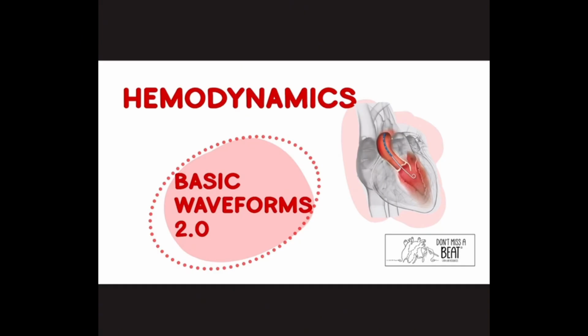Today we are continuing a conversation from a few months ago about hemodynamics, and what we are focusing on right now are the waveforms. So we're going to walk through each of the chambers. Good news is, even though there are 6 areas, 2 of them are the same, so you really only have to learn 3 waveforms and kind of walk through what you're looking at when you're walking through each chamber of the heart and what all the waveforms are.